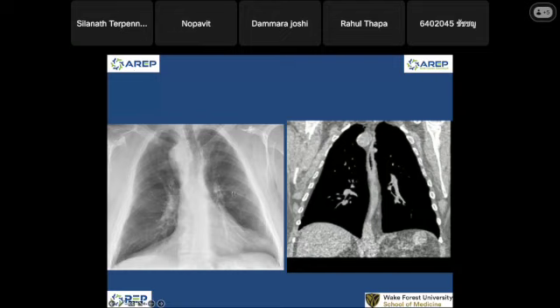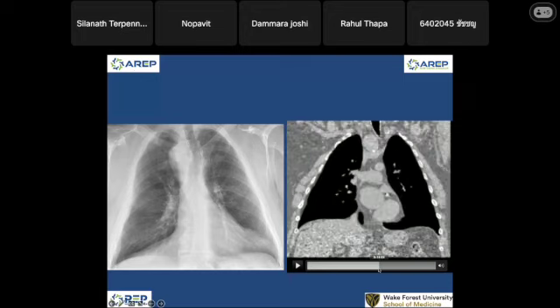Normally we don't have a right-sided arch. We have a left aortic arch, not a right arch. But in this person, the aortic arch is on the right, and it's pushing the trachea away. It looks like a mediastinal mass. Follow this guy. You can follow it to the heart. See that?